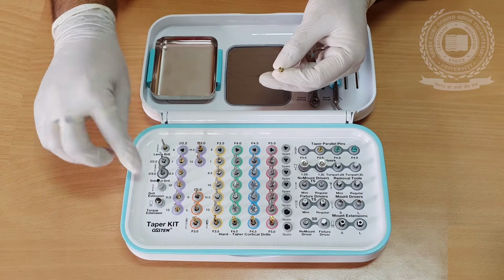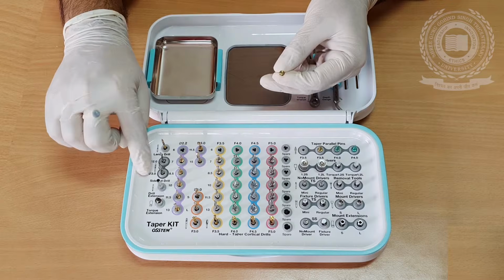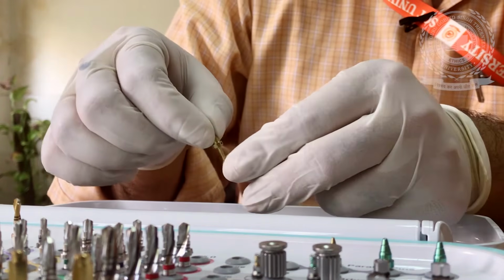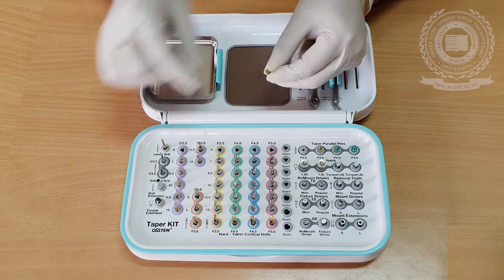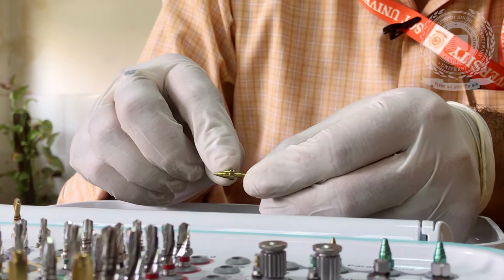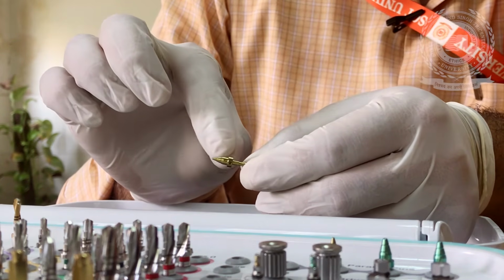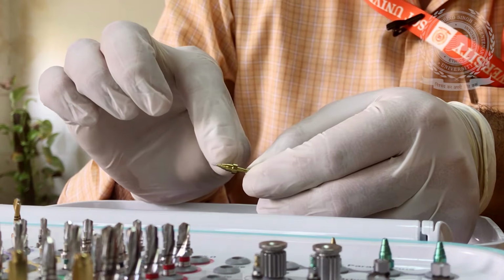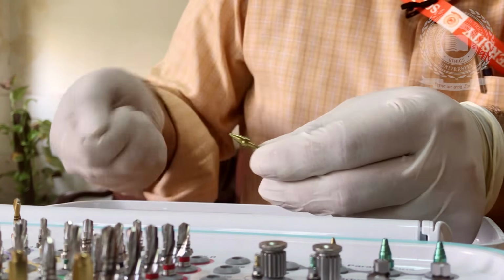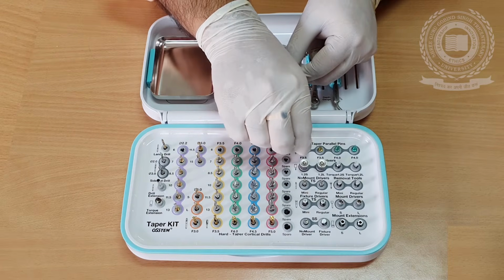As you can see, it's written side drills. They are available in two diameters, 2 mm and 3 mm, and on X-ray if we find that we are going in a slightly wrong direction, we can use these drills. And as you can see, there is a little hole in this. The hole is provided to place floss so that the patient will not engulf it. It will give protection. You can keep the floss outside the mouth so that the patient will not engulf it.